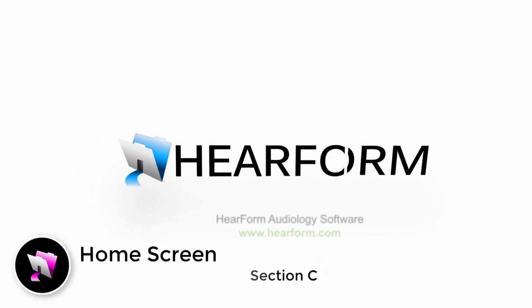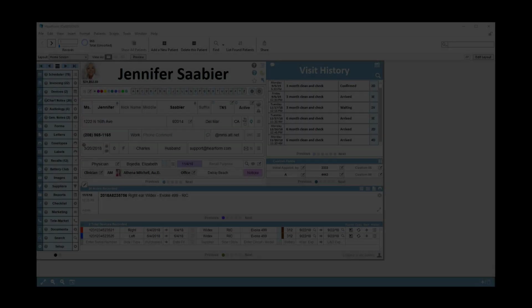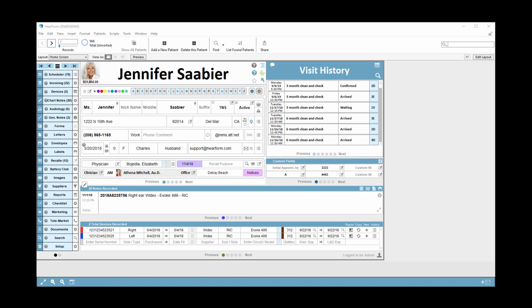Welcome back. This video will explain how to work with Section C of the HearForm home screen. Section C on the HearForm home screen includes the chart notes and hearing device slider panels.